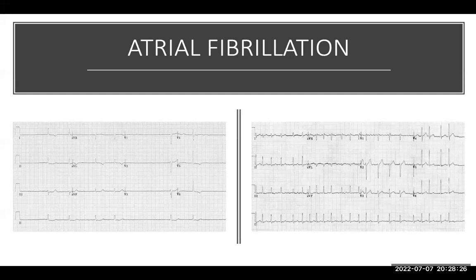Now, what is the importance of atrial fibrillation in OSCE? Identifying is very easy. You just look at here, this thing is irregular and there is no P wave. Why is it important? Three things. Number one, you may be asked, a patient who has got atrial fibrillation, what is the most important thing or how do you approach? Regardless of whatever you forget, don't forget one thing. You just say, I will evaluate the patient for stroke, because that's the most feared and most important complication.